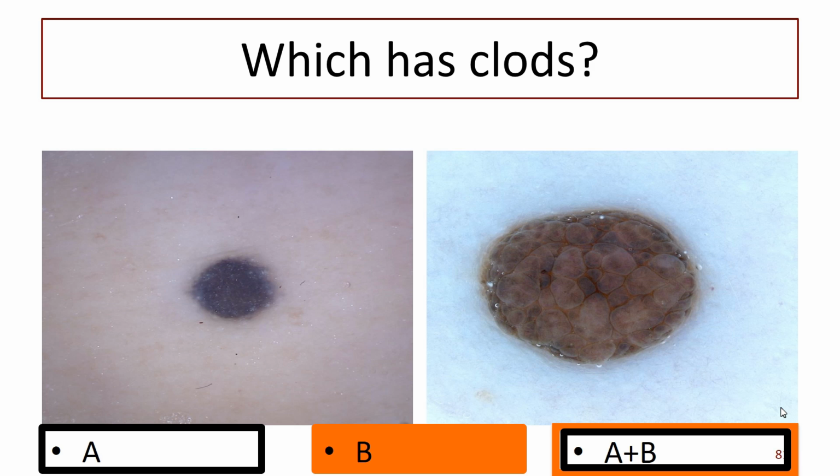Suzanne, tell us about, you've got orange up. The one on the right has joined up clods. Well, they're not quite joined up, they're separate. Yeah, they're separated. So there's the same sort of thing here as here. They're not identical, but similar in pattern.